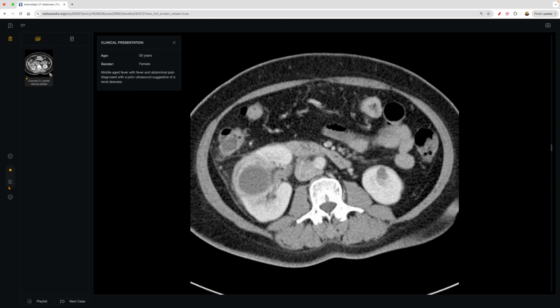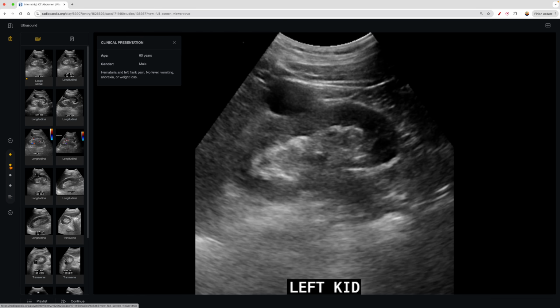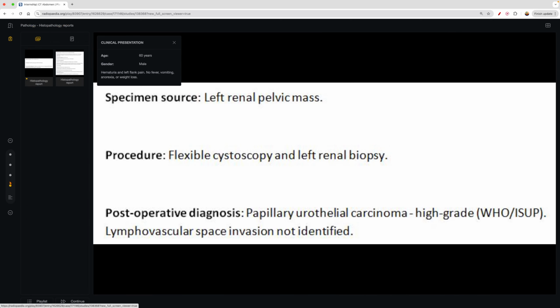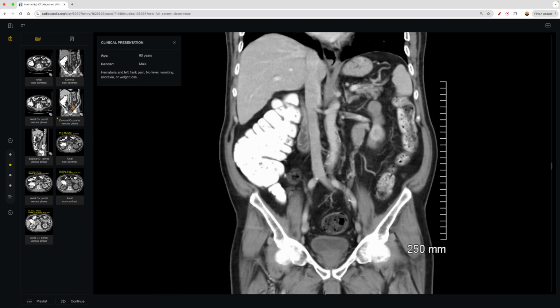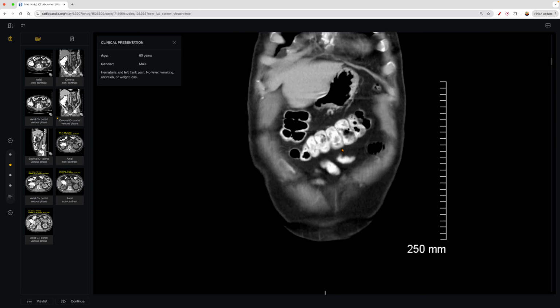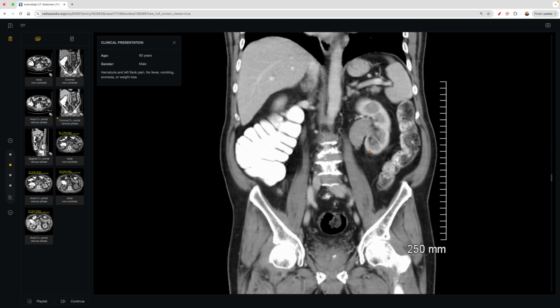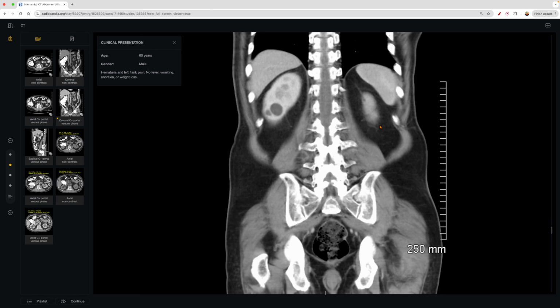And then for our last case here, there's a bunch of ultrasounds I'm not going to cover. Let's see here. That's that, and I think this was the resolution. Okay, so let's start with the contrasted study. Certainly if you're a medical student, this is not something that you need to diagnose or even know in terms of boarding exams. But what is important to note is how similar the diseases do appear.